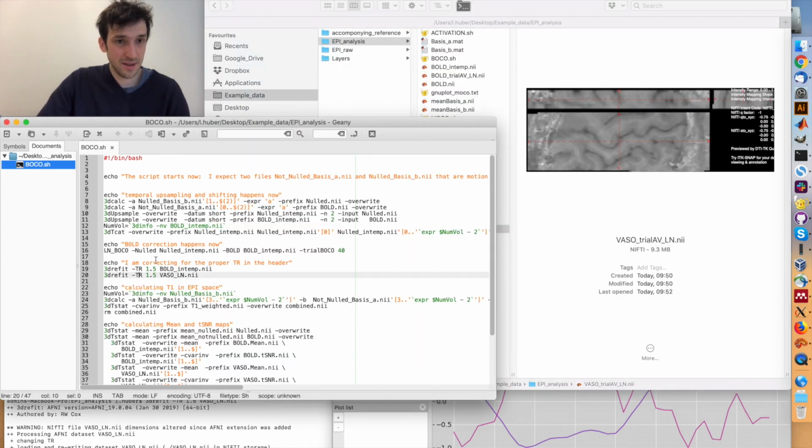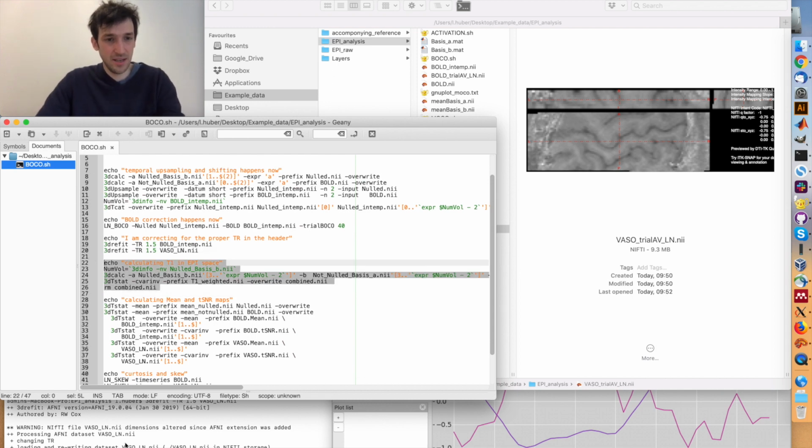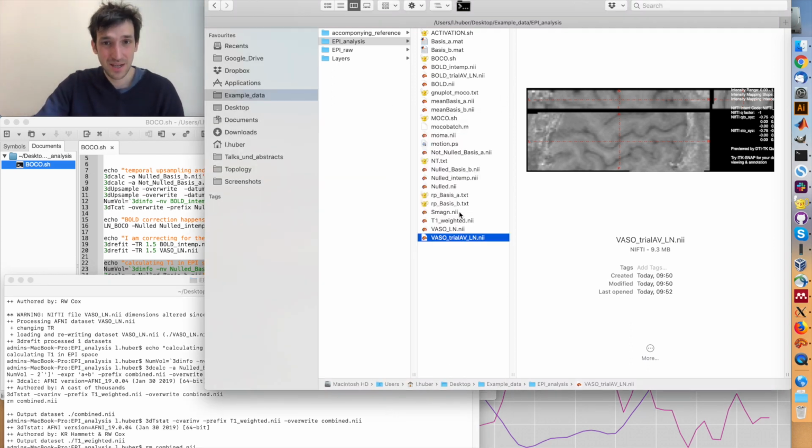The next thing that I always try to do is also some anatomical reference estimation directly in EPI space. VASO looks very similar in the sequence domain to a conventional MP2RAGE anatomical sequence, with the advantage that it's directly acquired in EPI space from the same data that I used for functional imaging.